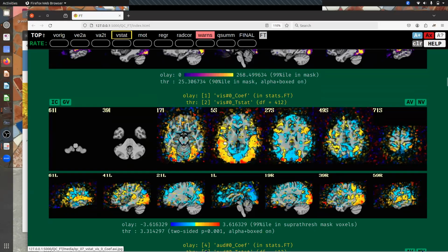The visual data set, if this looks familiar, it's because you were awake 10 minutes ago when we looked at this. Thank you very much for that. And this is the kind of thing where loading up the data, changing color bars, setting it, all of that has been done for us automatically because we have a sense of what we want to look at, and it's much faster here.